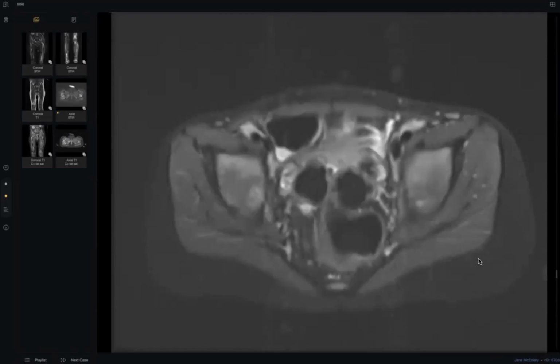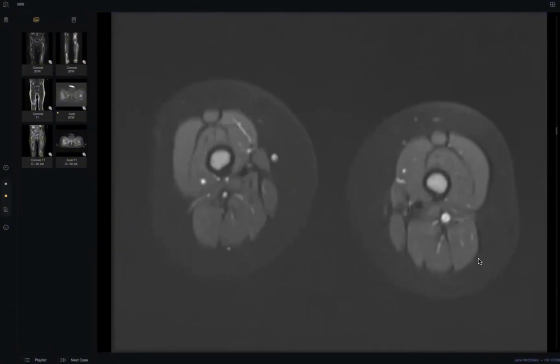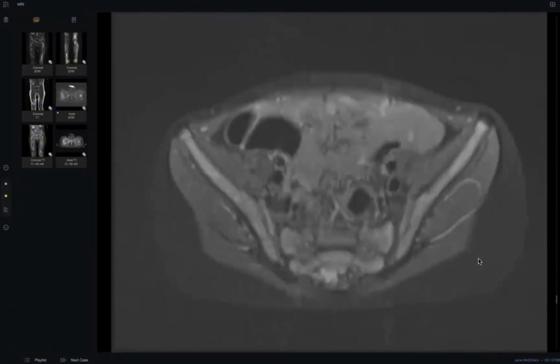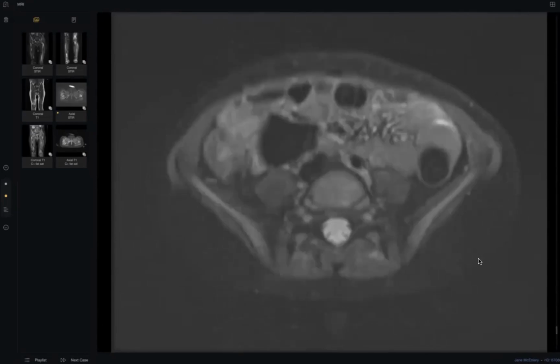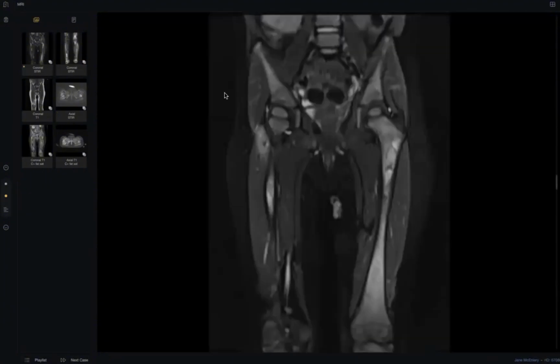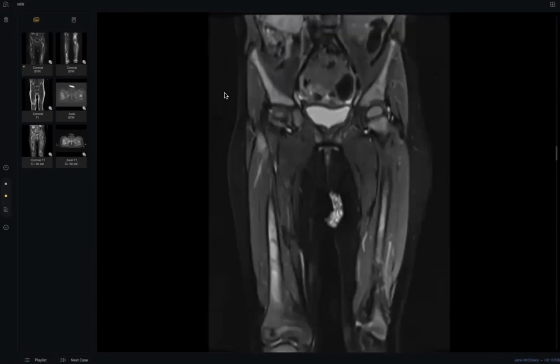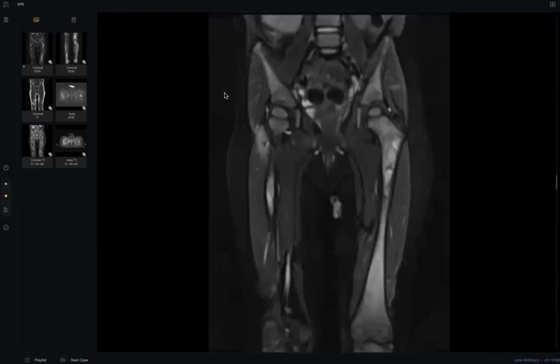Okay, this is a bone metastasis. Which anatomical part do you want to examine? Sir, the kidneys, specifically for the evidence of neuroblastoma, and the scrotal area for any germ cell tumor as well. And sir, I guess there is something in the right kidney. It's pretty bulky. Excellent. I would examine it further via ultrasound.